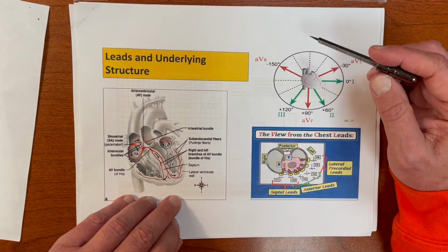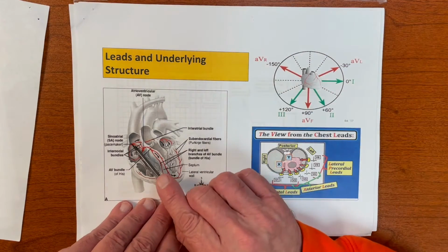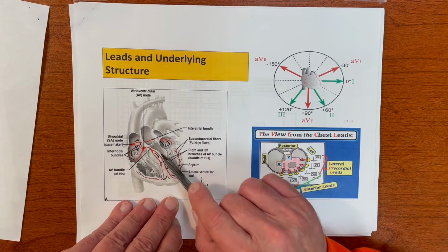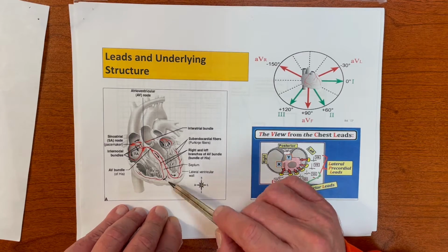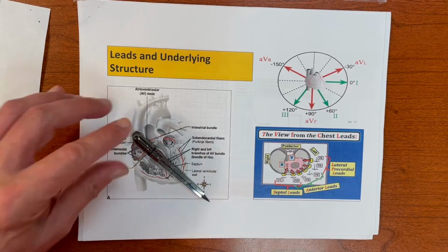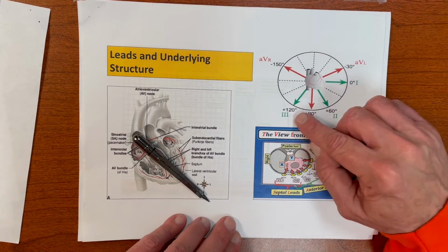little bit. Having said that, if something starts in the sinus node and has to depolarize the whole heart, if we summed up all the billions of vectors, it would summarize into one vector going away from the sinus node towards the apex like that. So we're going to use that to our advantage. A vector, understanding where these leads are.